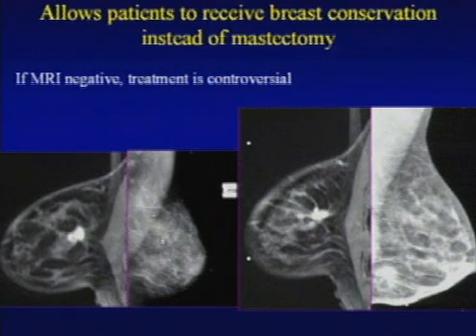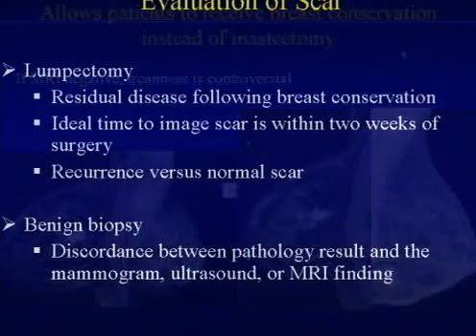2 other cases, you can see usually these patients have pretty dense breasts. I really can't find a tumor in either this mammogram or this mammogram. But once you find this cancer, really the patient's treatment is altered. Now they can go ahead and have a lumpectomy. Now they can really find this tumor and find out what chemo regimen the patient will best be served by. Without finding the tumor, the majority of these patients go on to a bilateral mastectomy.